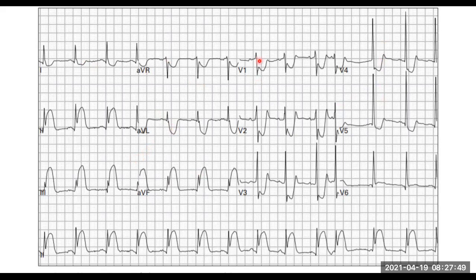So can I ask you, could the posterior part be having ST elevations? It's very possible. Okay. So this is the one thing that we need to check whenever we see these inferior right-sided MIs. And this one here, V6, just the fact that it's going up a little bit also gives you a little clue that this could be posterior. Because V6 is also placed more towards the back, so it's also looking towards this posterior part of the heart, and we start seeing this little ST elevation.